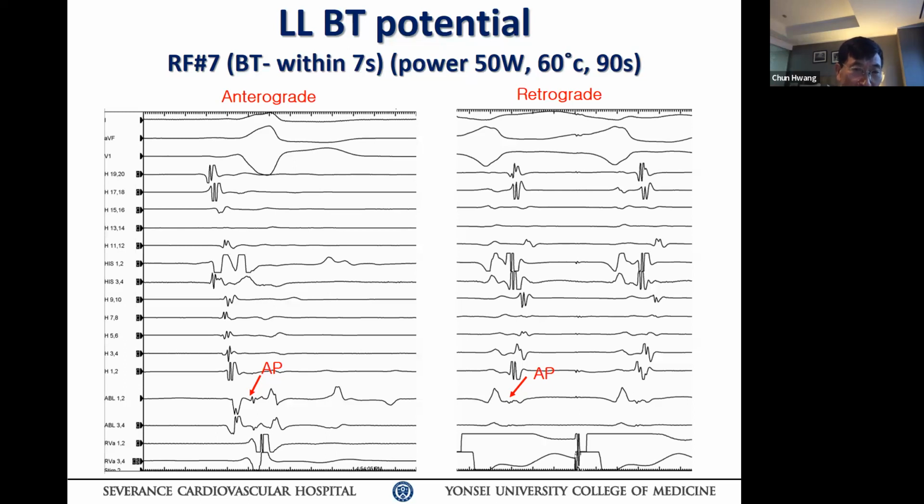You see, your accessory pathway conductions are everything or nothing. What I'm saying is, once you have a dominant accessory pathway, fusion is almost rarely seen. Because your interseptal pathway is located so close to the sinus node compared to your left lateral pathway, there's no time for the left lateral pathway to manifest. That's what I said. You need to look at the distance of conduction to start thinking about this.